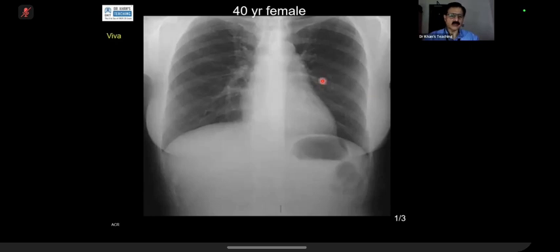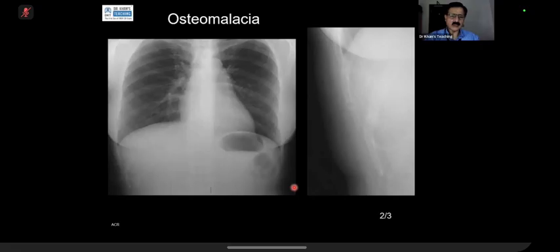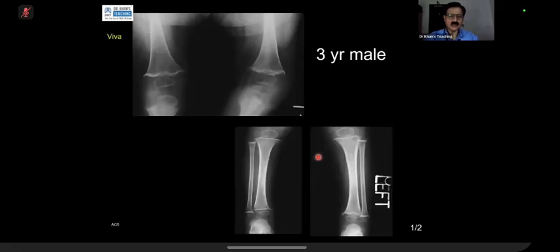Yes. Okay, good. So if you see here, look at this one. By the way, I'll show you a close-up, but this is it. Having said that, retrospectively speaking, it can definitely be seen on this X-ray also. So this is a looser zone in the ribs.